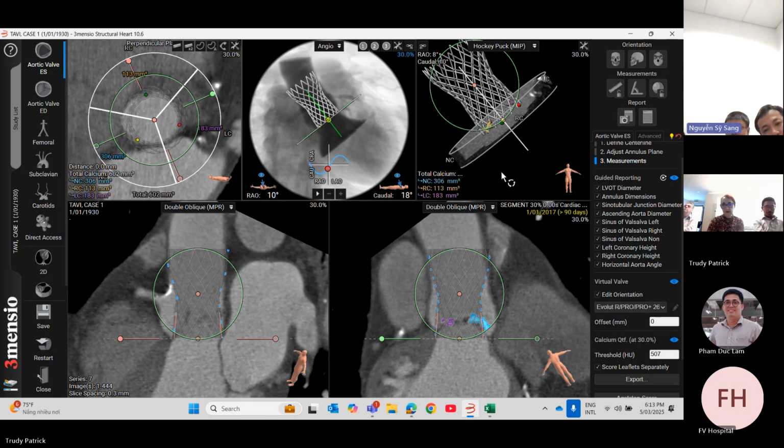So standardly, what phase do you choose to analyze systolic, diastolic, and what percentage? We would say the majority is done in ES and not ED, but there is an option to do that. So those are the two options you get in the software, but we always do our workups in systole. You can choose what phase. If you have a multi-phase scan, you can choose which phase you want, either systolic or diastolic, 30%. You can have a multi-phase scan and then have the measurements on each phase.